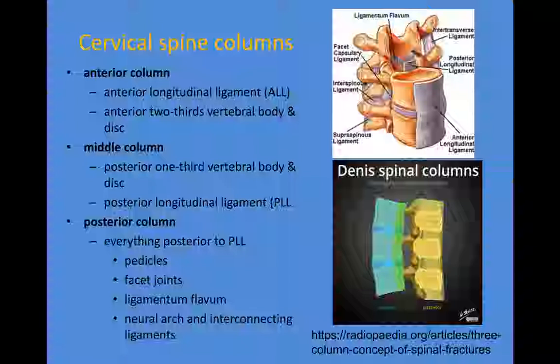And in between those two, you have your vertebral body and your discs. Then posterior to that, you have your spinal canal. And on the sides, remember that your vertebral bodies are forming a ring shape coming back to the lamina and the spinous processes, and running in that spinal canal is your spinal cord.